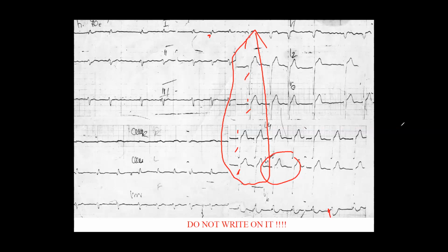Is it some kind of maybe necrosis of the heart? Yes, that's not a necrotic sign, because left bundle branch block itself causes a pathologic QS complex all the way in the anterior leads. This is why it's difficult. It's very difficult, basically, to diagnose an MI in case of left bundle branch block.